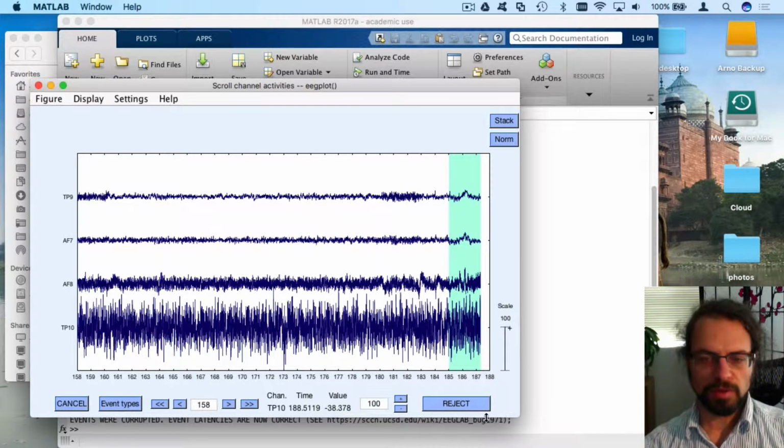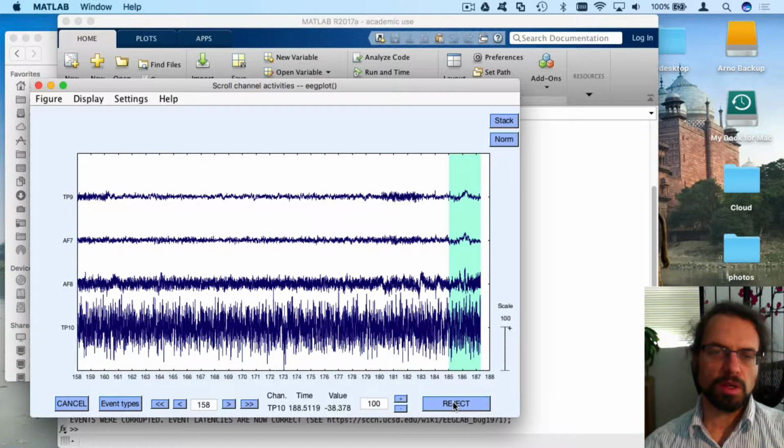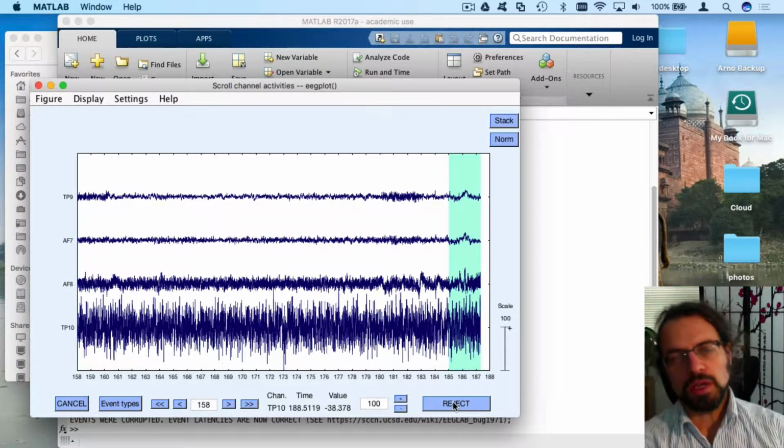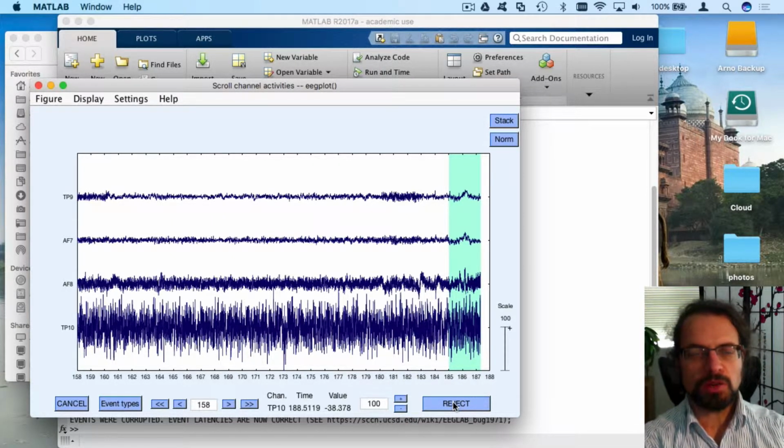It's better to have less data, but very good data, rather than more data and bad data. In this case, that's pretty extreme, and in general, I would remove about 20% of the data. Here, the data is relatively bad, so that's why I have to remove much more of it.